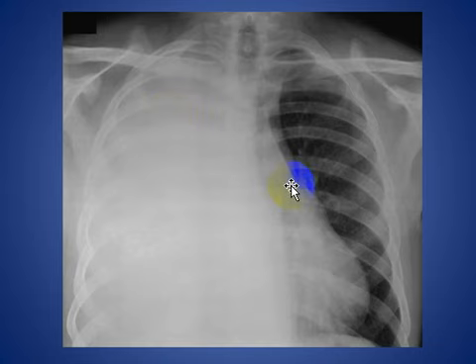Another differential diagnosis is pulmonary infection involving the whole lung, with no shifting of the mediastinal structures. Another is a pneumonectomy, and we see the surgical intervention with clips or missing ribs involving the site of the pneumonectomy.